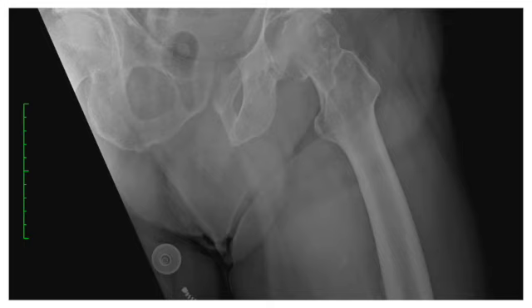So again, on this radiograph, we see prominence of the lesser trochanter with external rotation of the hip. We see a line of linear sclerosis involving the subcapital region of the left femoral neck, and we see an acute margin along the femoral head-neck junction, which can be a sign of an acute hip fracture.